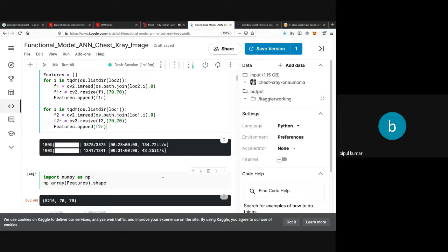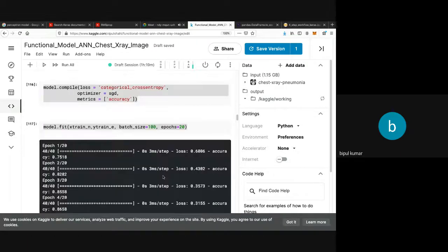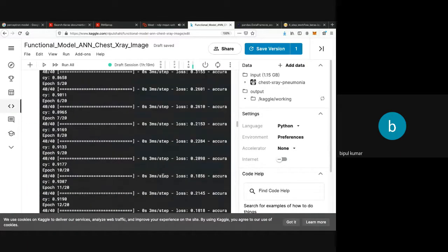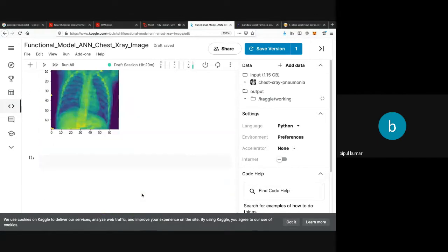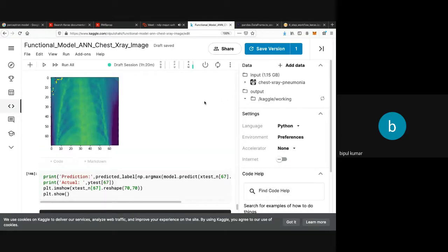And while training the model, I don't know, it will take half an hour. Without the help of a GPU, if you try to train the model, it will take almost half an hour, because you can see how many learning parameters there are. The learning parameters are above 10 lakhs, right? This is the learning parameter count when we skipped two hidden layers. When we are using some hidden layers, there are more than 10 lakh learning parameters, more than 1 million weights. That's why a GPU is very important while we are working with these kinds of things, right?